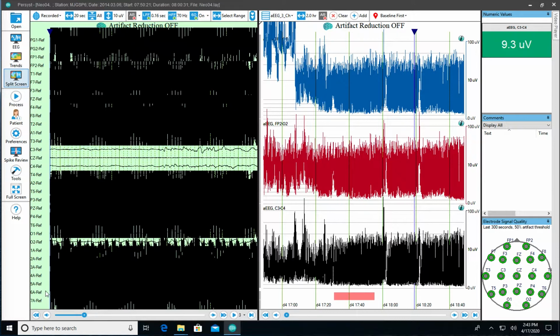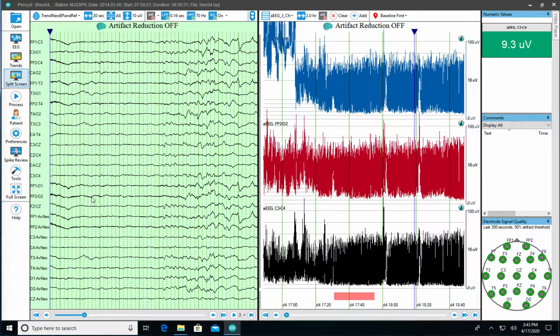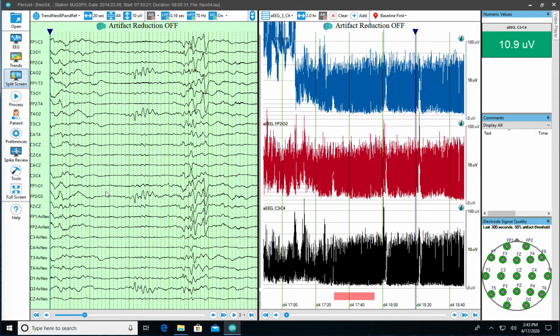Normally that's not an issue, but something to think about is that Persyst will look at all of the channels coming in if it's told to. That has to do with the configuration of the trends in the trending montage. If we go to the trending montage, in this case we're going to go to trend, neo, BP, and ref, and we'll talk about what a trending montage is. All of these channels have EEG on them, so we're okay there.